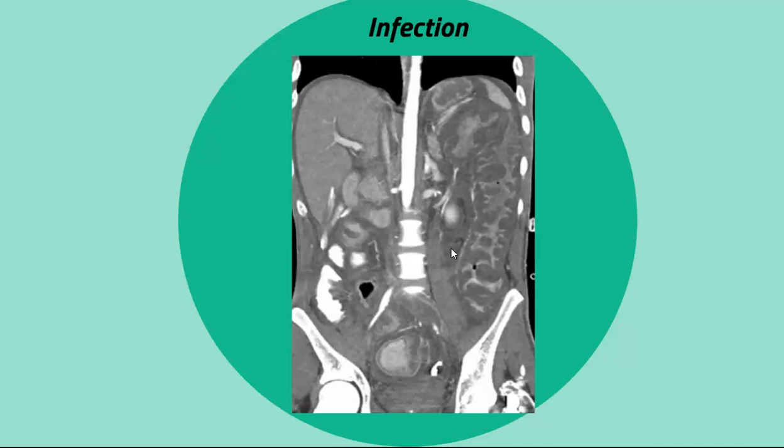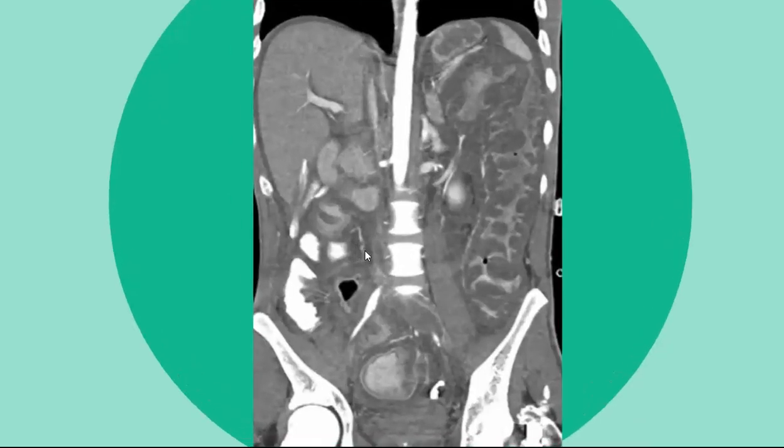Small bowel obstruction is atypical. The distribution of findings can suggest the causative organisms. Giardia tends to involve the proximal small bowel. Yersinia and Salmonella often affect the distal small bowel. TB preferentially involves the terminal ileum. C. diff remains one of the most common hospital-associated infections. Approximately 60% of unwell patients develop a pancolitis with diffuse colonic wall thickening, which we can see here of the descending colon, and this is called the accordion sign.